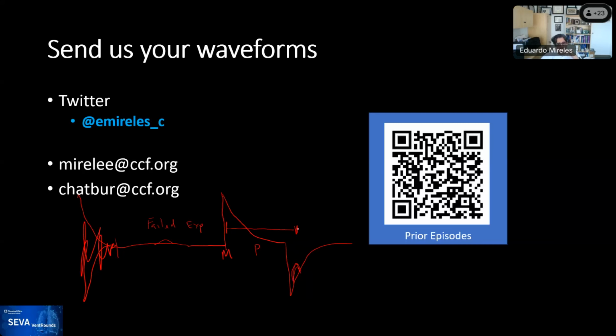This has not been defined perfectly, but what is uncontroversial at this point is that if you have a mandatory breath followed by patient activity during inspiration, there is no question that this is an early trigger, also called reverse trigger.